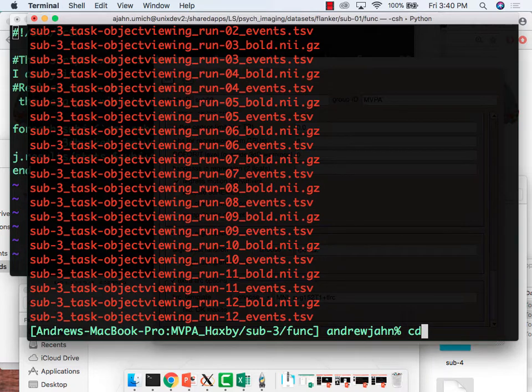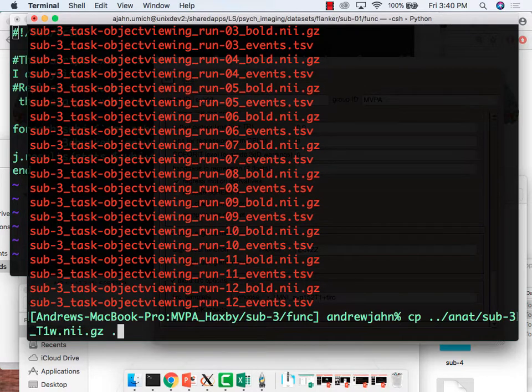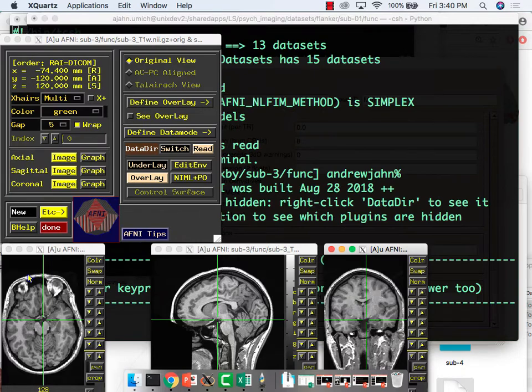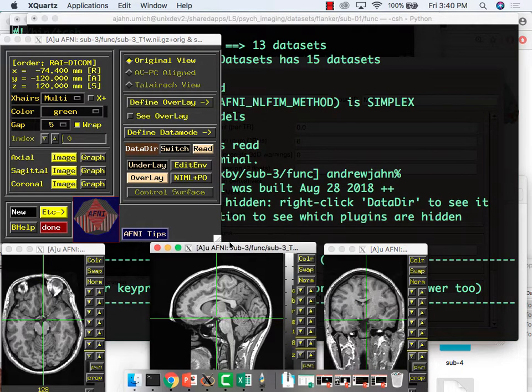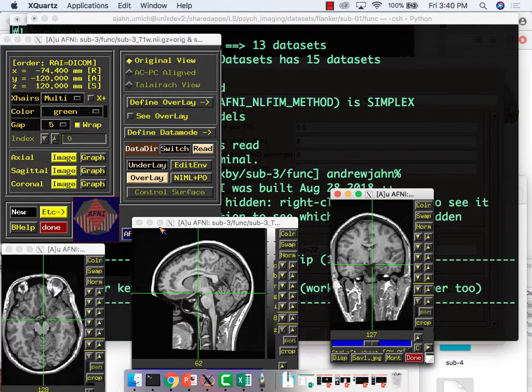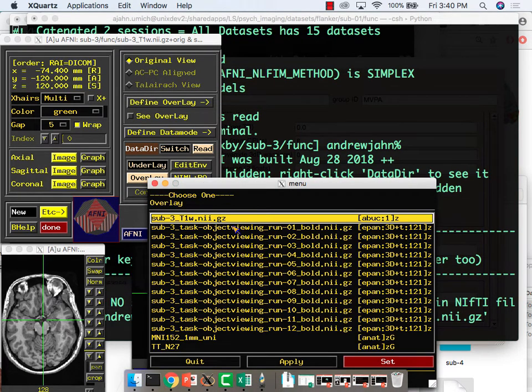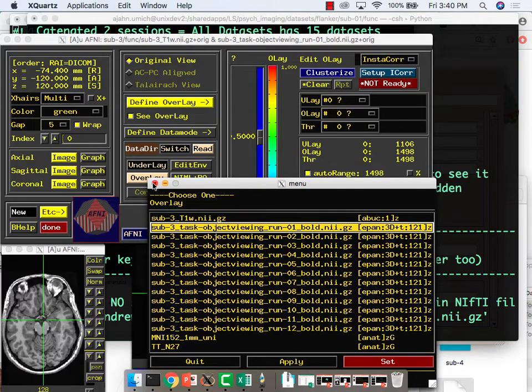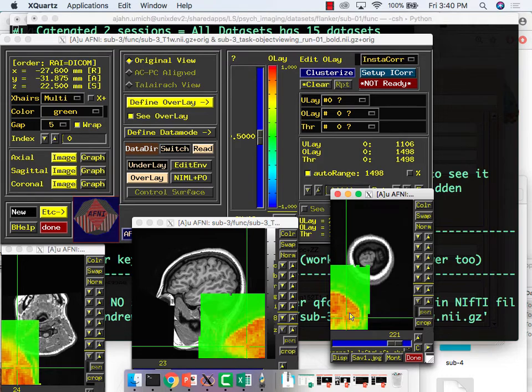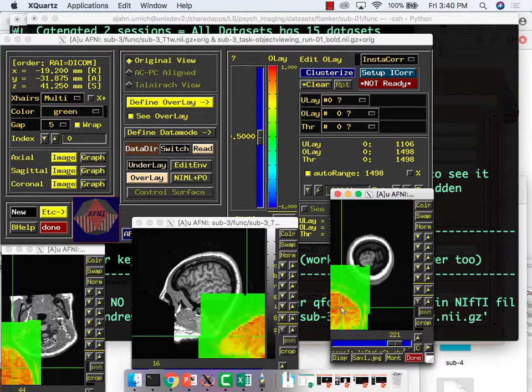Okay, so what I'm actually going to do is get both the anatomical and the functionals in the same directory. Again, you won't have to do this because we're all checking this together. So here's my anatomical. I try to overlay one of these on there. And it turns out they're so far away from each other, they're not even, yeah. So you see why you've got to check this, right? So let's leave that on. Sound good? Yes. All right.